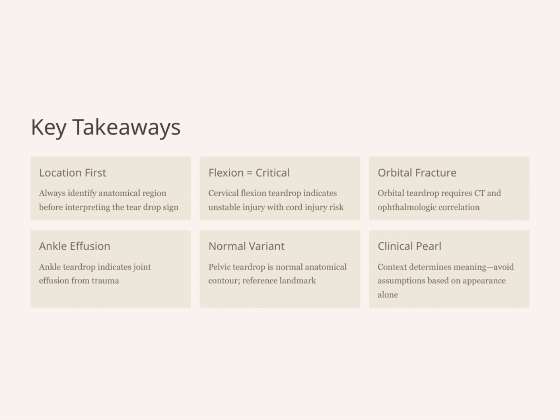Now, a quick note on normal anatomy. The pelvic teardrop is actually a normal contour, a reference landmark. So not every teardrop shape indicates trauma. Sometimes it's just normal anatomy.